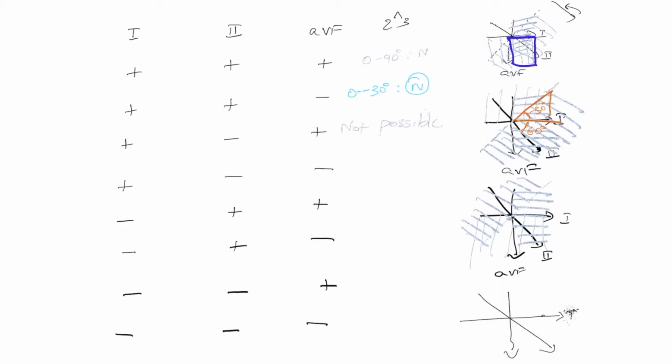So we'll go ahead and label the axis. All right, we said 1 is positive, so that would mean it's somewhere here. Then we've said 2 is negative, so again, let's draw the imaginary line perpendicular to 2, and 2 is negative, which means it's somewhere there.